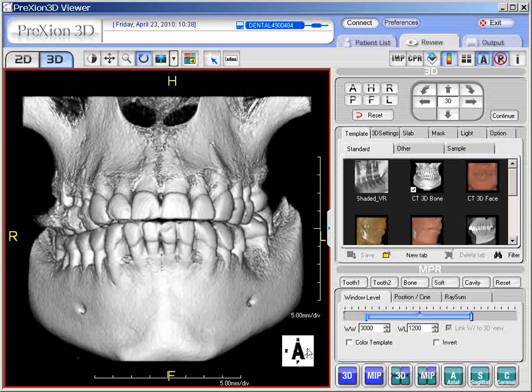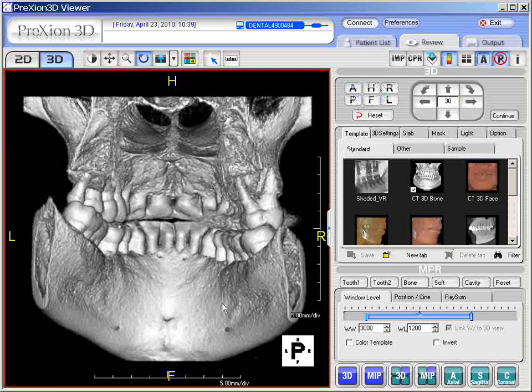A stands for anterior, and also you have the letters that are colored yellow. H is for head, F is for foot, R is for right, L is for left. The other way of going to those particular settings for orientation is you have these boxes labeled here. If one clicks on, let's say, P for posterior, now you're in the posterior projection very quickly. Here's the letter P, and now you've also inverted the left and the right by 180 degrees.